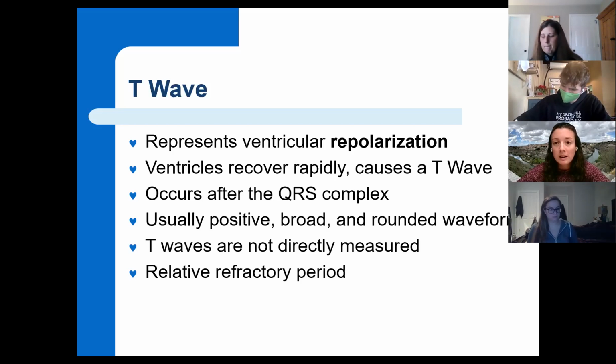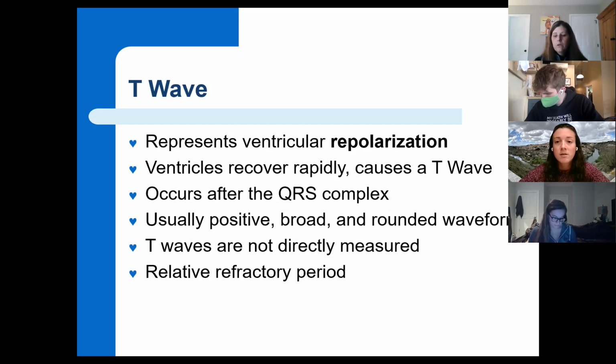So does that mean you're more likely to have an absent P wave with a QRS instead of an absent T wave with a QRS? You mean in the contraction following it? Yeah, we'll look at some examples where you may not see a P wave, where it might be embedded if it came early in the T wave. But if you only have one little bump after a QRS, don't mistake that for thinking, oh, must not have a T wave. That's just the next P wave. I'll show you some examples. Yeah, good question.